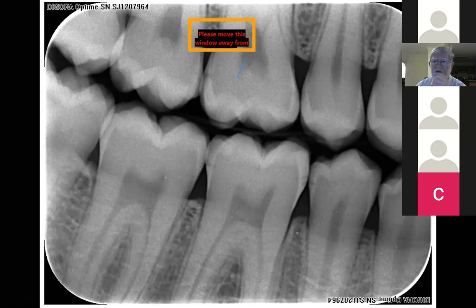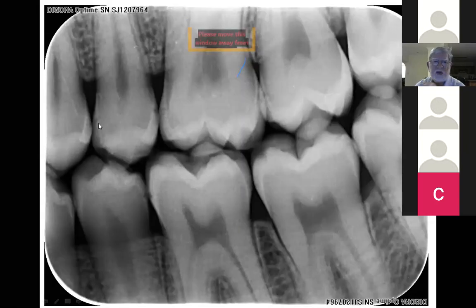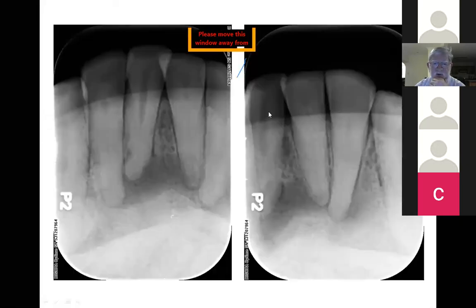Okay, so we're getting responses here. Distal 1.6. We're seeing distal 4.5, mesial 4.6, distal 4.6. And he's biting on the other side. Same thing. Mesial 5, distal 5, mesial 6. Possibly, I've got overlap, possibly something going on there. Mesial 6, distal 5. And again, you know, he's got to start flossing.